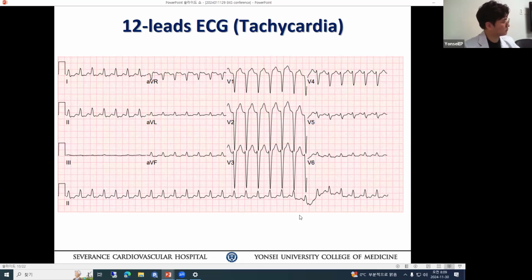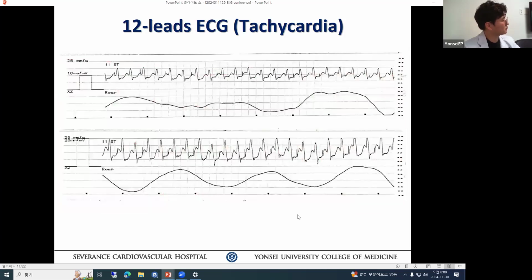Okay. Next slide. Let's take a look. What do you see here? Is this pacemaker working? Not working? First thing. Not working. Falling all over the place. So then, what do you say? Non-sensing, non-capture. So this pacemaker, atrial lead probably, most likely atrial lead.